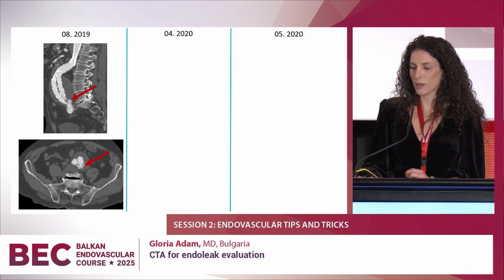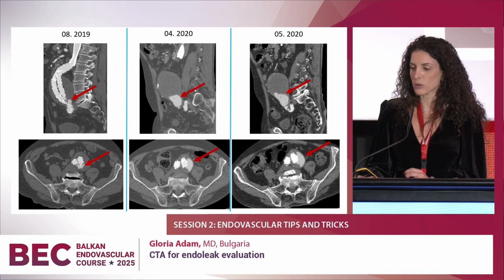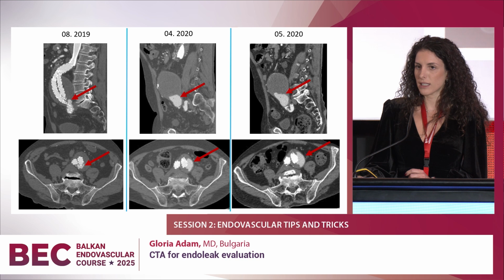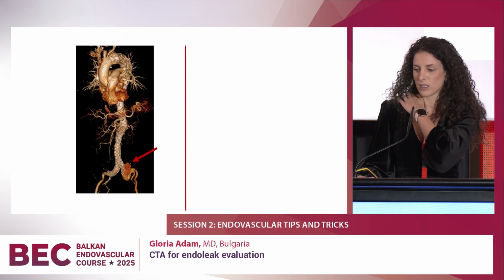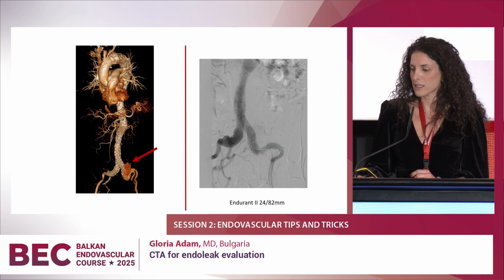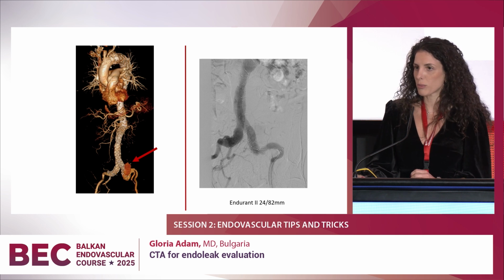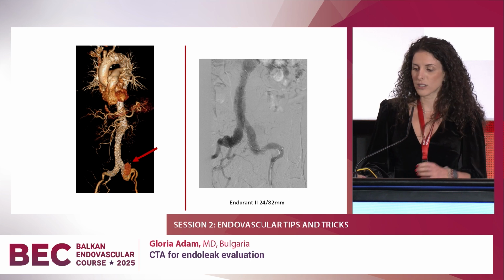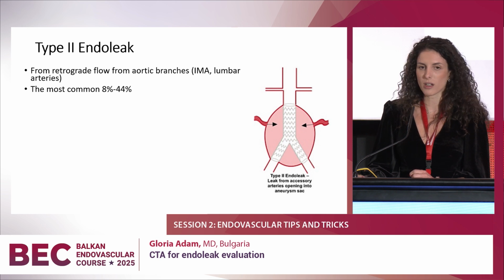So it was follow-up, that's what was decided, and the endoleak actually enlarges with time. That's why it was decided to be treated. Here is the endoleak with 3D visualization on CT, and this is the effect after the treatment. No endoleak in that area because an Endurant stent graft was put in the common iliac artery to seal further the area that is leaking.